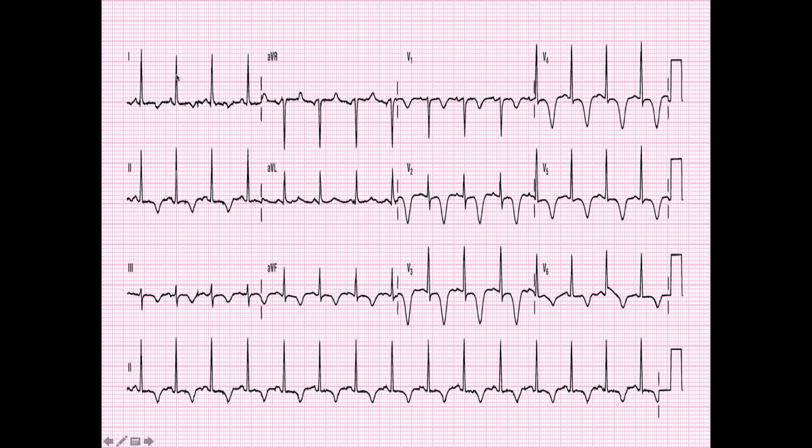What about atrial enlargements? So I don't see any. You might be able to. I think we could argue for left atrial enlargement. The P wave in lead 2 looks a little bit wide. It looks like we might have a little notch here in the P wave in lead 2, so maybe some signs of P mitral. Look at V1. Definitely a biphasic P wave, and we could again argue for that second part, that negative part of the P wave, being a little bit larger.